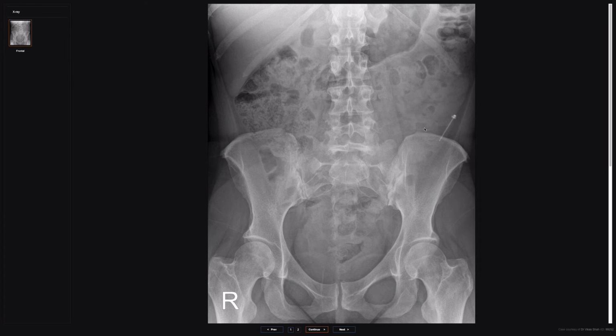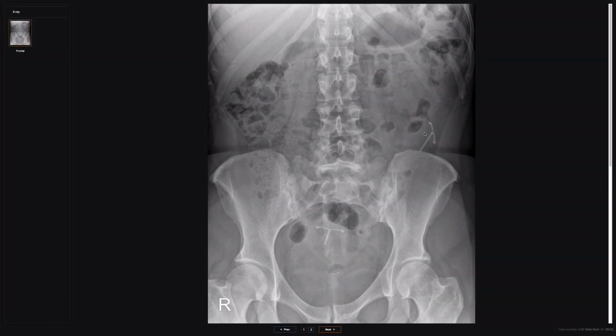Anyway, they couldn't find this at laparoscopy, and they placed a new IUCD in the uterus, and for some reason requested a repeat just to check, well, where is the other one? So in fact, it's still there. And now you can see it slightly moved, so you can see the arms of it, and then this is the one in the pelvis that's successfully placed in the uterus. But because there's no clinical consequences, the patient wasn't suffering from inflammation or abscesses, they've just left this in.